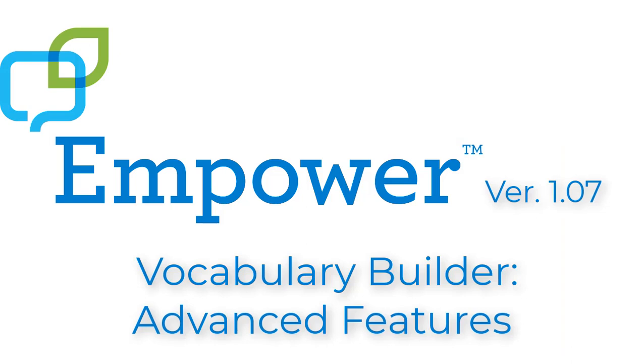Thanks for learning about the Advanced Vocabulary Builder features in Empower version 1.07.